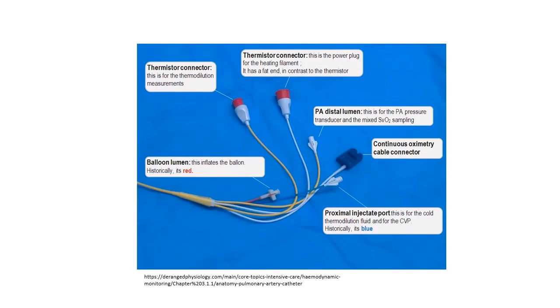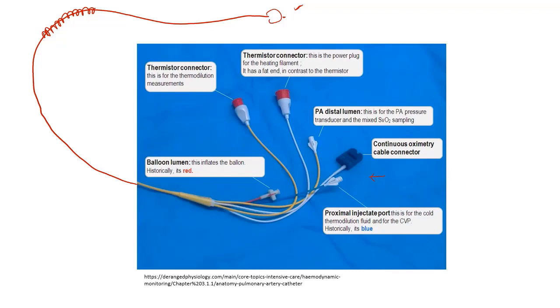And so what differs, I apologize it's not in this picture, between the last one we saw, is that on this catheter, if we imagine this is our catheter, here's the balloon, here's the tip of it here, rather than injecting cold saline into the catheter and then detecting it further down the line, it has a coil, like a copper appearing coil, that actually heats the blood up. The blood is washed down to the sensor, and then it's detected and it gets at the cardiac output by the same temperature change curve that we talked about before.